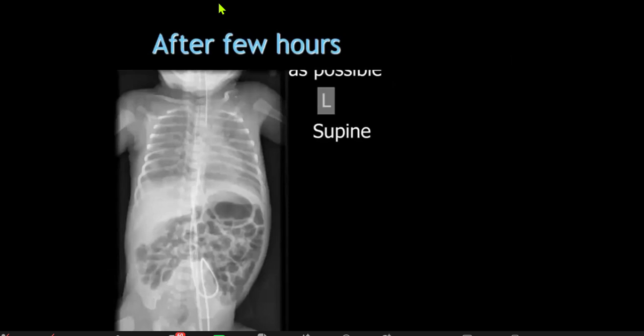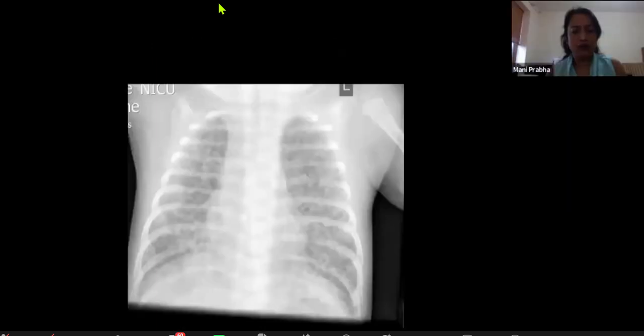Okay, so and if this is the same patient, so this is a babygram, and just concentrating on the lungs, there remains some granular opacities, but the patient has now been intubated. There's an increase in the lung volumes, and some branching interstitial lucencies suggesting a degree of pulmonary interstitial emphysema formation. Okay. I could comment on the tubes and lines as I would in my general practice. Yeah, sort of normal, so we'll leave that.